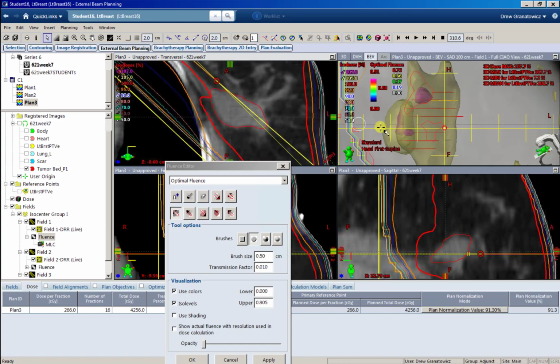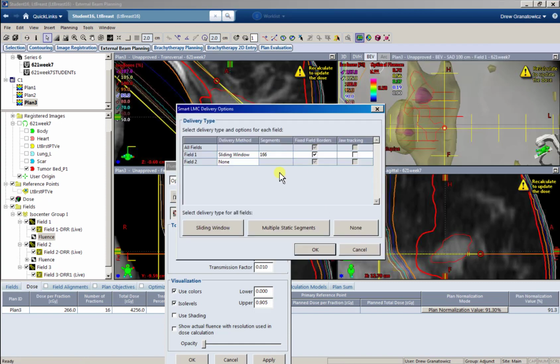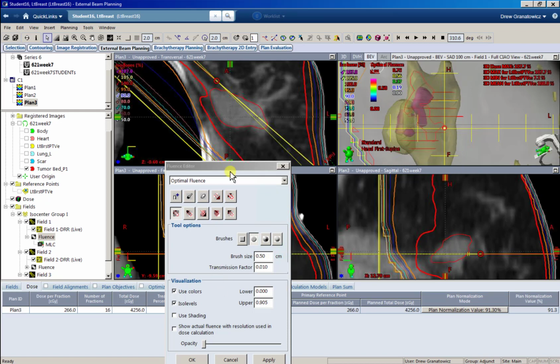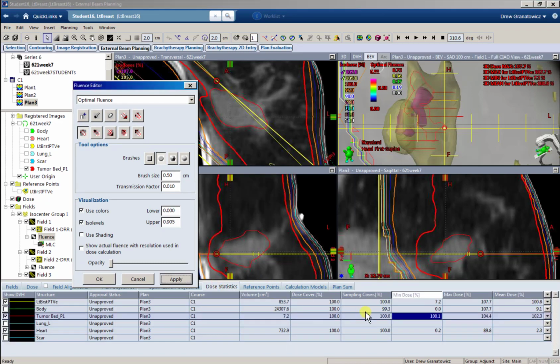Probably right here, which is nowhere near where we painted earlier, but oh well. 100.1.